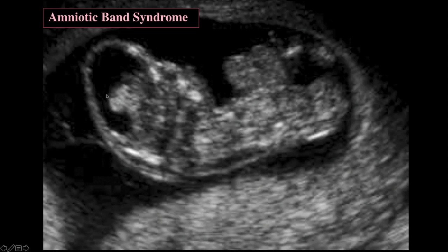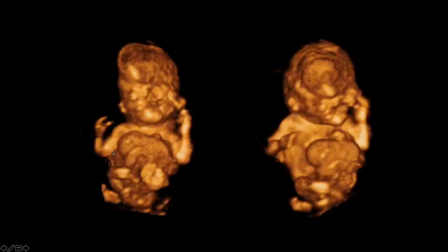And the best way to see how it disrupted, you see the bands here actually, the best way to see how it disrupted the face is to look at the 3D, and you can see this big gash right in the middle of the face where this thing just ripped everything apart. You know, there's no embryologic way to explain this other than amniotic band. This is a destruction of something that was already forming. So you really can't mistake it for anything else, I don't think.